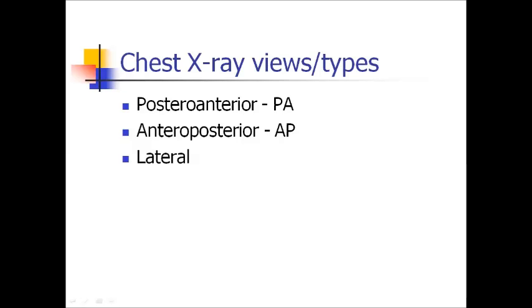Chest X-ray main views, main projections are posterior anterior, anterior posterior, and lateral. Usually posterior anterior and lateral projections are widely used.